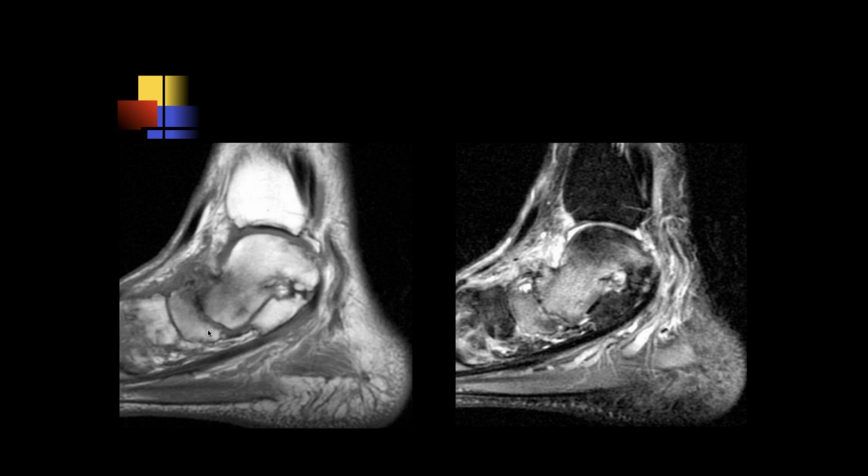Okay, Ashu. Or actually, I'm sorry, Michael, I think you're next. Yeah. So the first thing is severe degenerative changes of the talonavicular joint. There's an extensive amount of edema throughout the talus and the navicular, with bone-to-bone articulation. There's joint effusion with probably synovitis as well. The amount of edema looks like more than just normal degenerative changes. I don't know if there's some component of osteitis and inflammatory arthropathy with secondary osteoarthritic degenerative changes. If you notice, the orientation of the talus is pretty vertical.